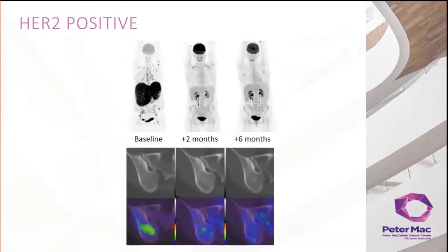You could ask, did we need to add FDG PET CT to our primary staging investigations at this point? Hadn't the ultrasound demonstration of distant disease answered the baseline questions? Well, I think this is a nice example here where FDG has still contributed. So despite her large volume disease, you'll see on her 2-month study, she had a complete metabolic response.